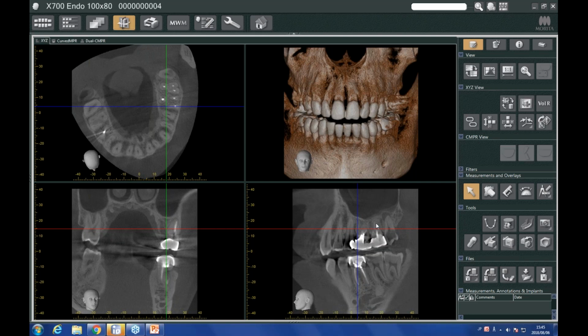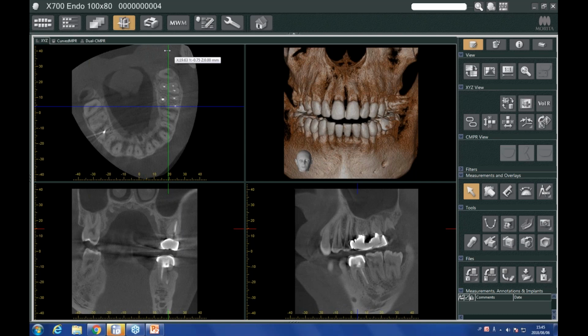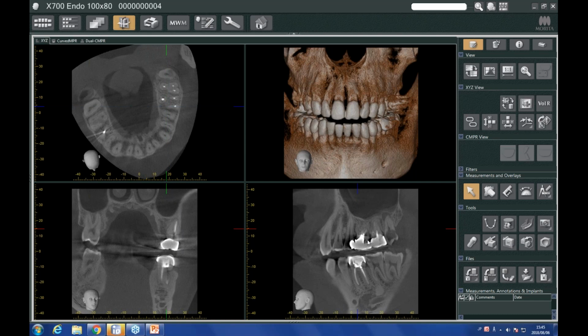Now, as I'm starting to move towards the patient's anterior, I really want to see the detail around where my mouse is hovering. So these lines, of course, I can get out of my way. Up here in the tools, there's a view button and the option to show or hide the positioning cursors. So I'm going to hide those. Now I can still, of course, grab them and manipulate them, but they're just sort of out of my way for the moment while I'm examining this particular patient.